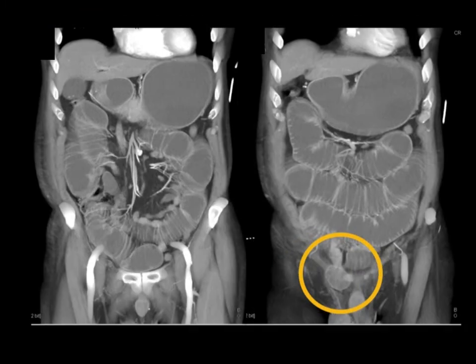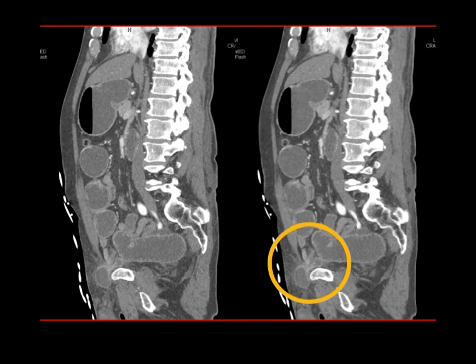In this case, the bowel and the so-called transition points are indeed very critical. And you follow this case down. Beautiful example of transition points and the hernia through the defect in the inguinal ring. And here it is not only on the coronal view, but on the sagittal view. Just a very nice example of showing you that patient's inguinal hernia.